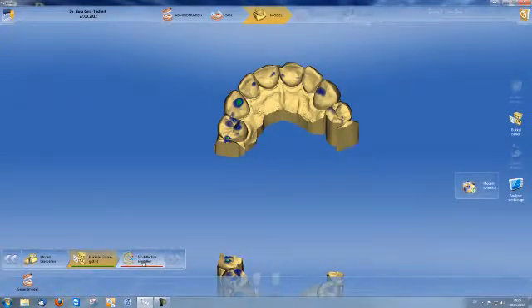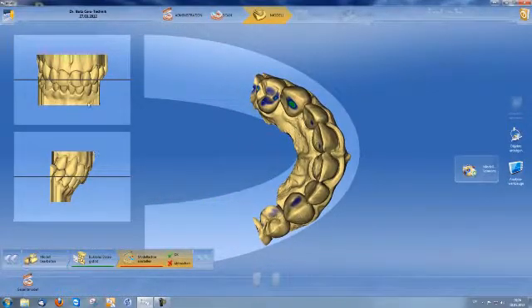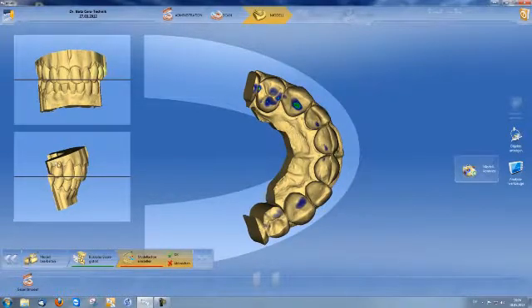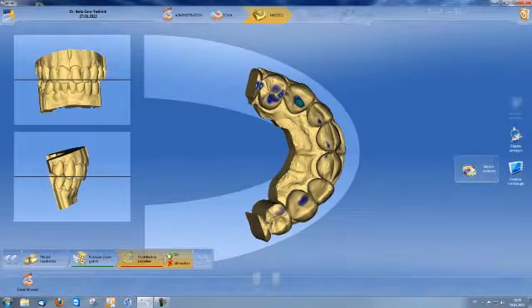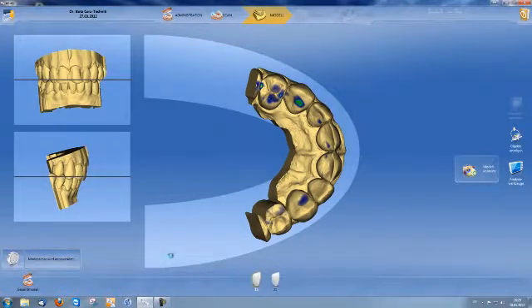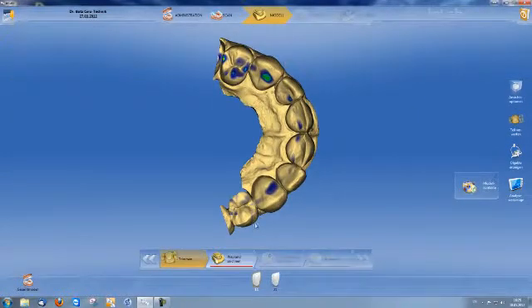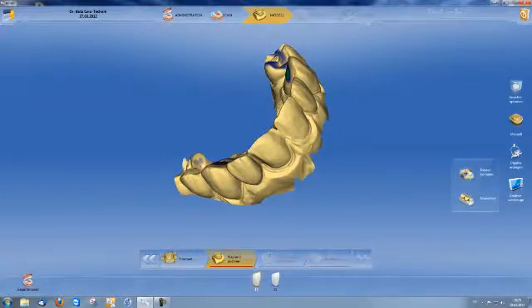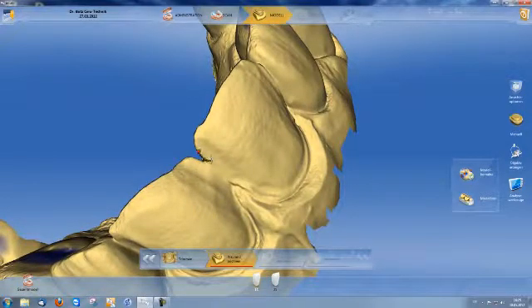I then go to Model Axis setting. Here, I perform the mesial and distal alignment along all three axes and also specify the midline before confirming with OK. I then determine the preparation margin for 11 and double-click to start.